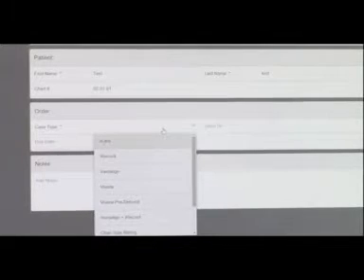So there's no pre and post model. Exactly. iRecord is the ability to do any sort of scan. It's an open STL file that you can then send to your lab to create whatever appliance you need.